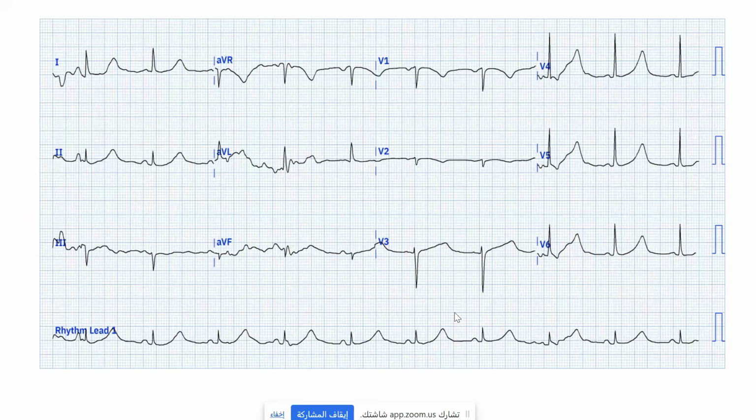What I am pointing to. You point about sick sinus syndrome. No, prolonged QT interval. Who's this one? Who's this? Who is with me? Which doctor? They vanish quickly.